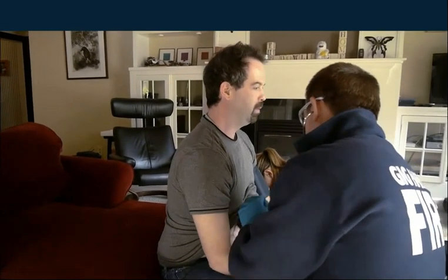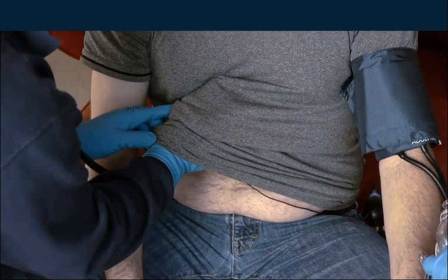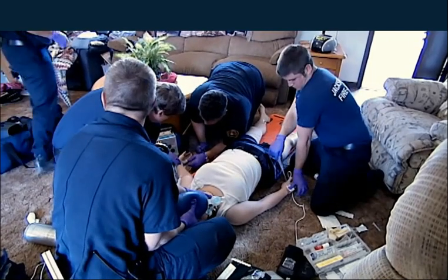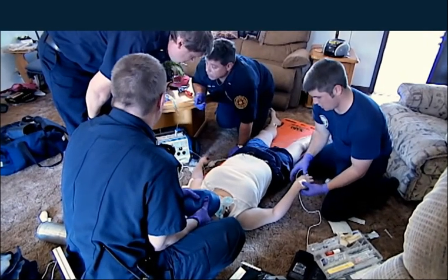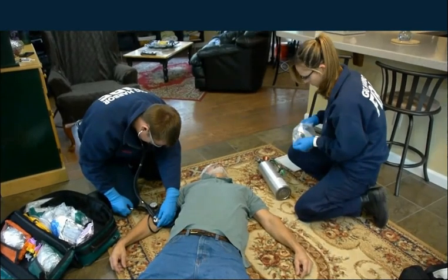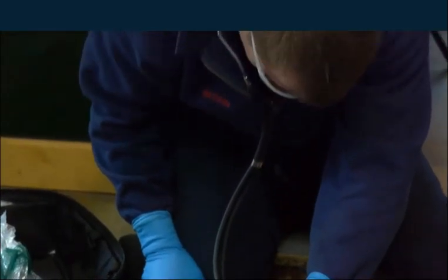with diabetes. Responders can utilize capnography to assess and monitor a patient's response to the treatment of pain. Patients in significant pain will often have shallow, rapid respirations that can be seen via the capnograph as a small and tachypneic waveform. Capnography has a host of other applications. It can identify and warn providers of oversedation from a narcotic by signaling hypoventilation, or indicate apnea with visual and audible alerts. Following a patient's seizure, EMS responders can use capnography to identify adequate ventilatory effort.